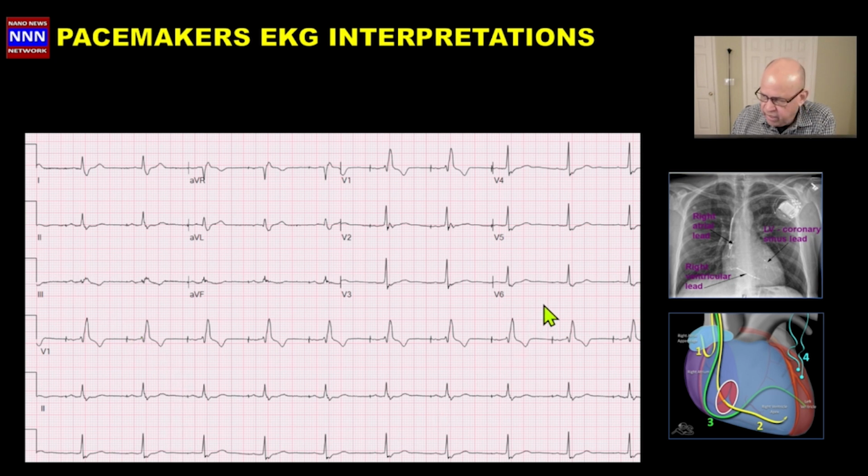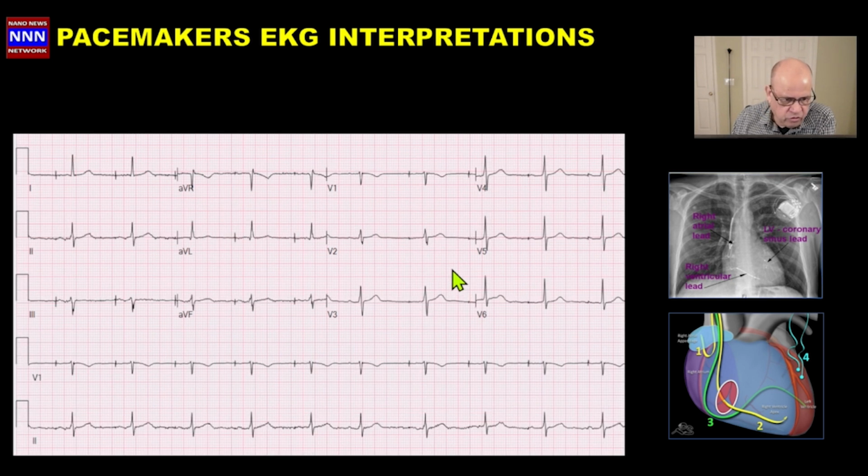Do you see anything else in this electrocardiogram? Okay, let's move on to the next one here. Again, we have an atrial spike here, and there's an atrial wave which looks biphasic, and it is consistently seen in all the leads. So we have atrial pacing, ventricular sensing, and a narrow QRS complex. The ST changes look okay, so that's fine.